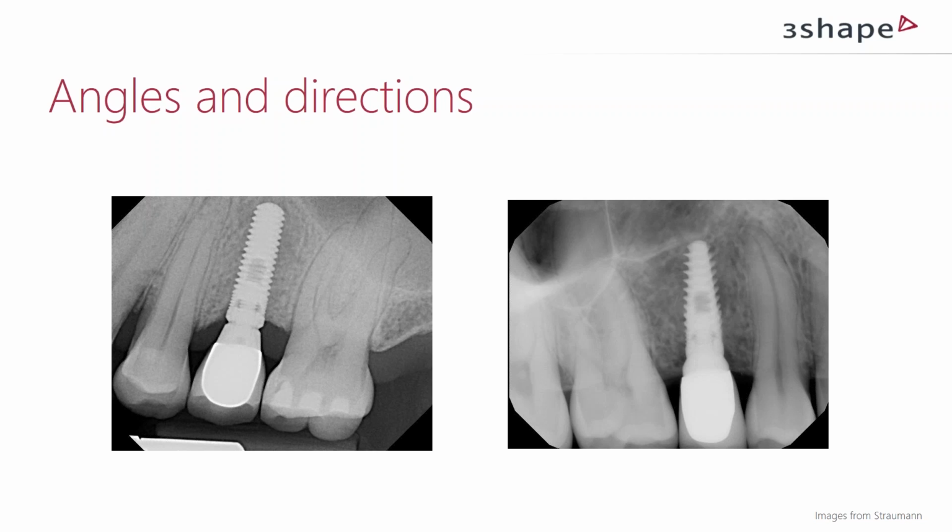When looking at these two implants, we can see that the surgeon here actually followed the rules very well. She tried to mimic here the length of the root. So the length of the implant is the same as the actual root, and the crown is not bigger than the actual crown, or at least in the same area.